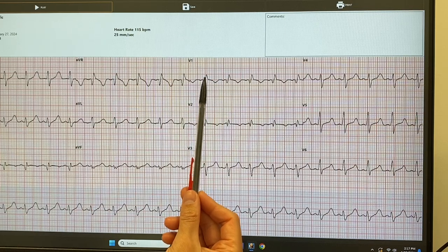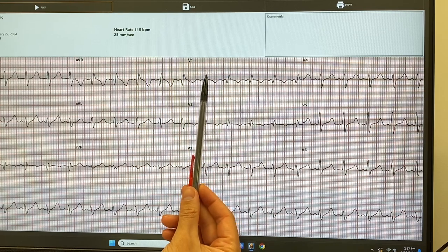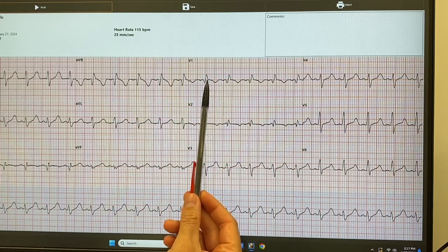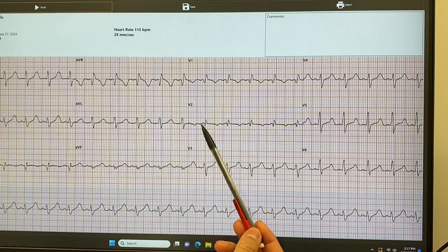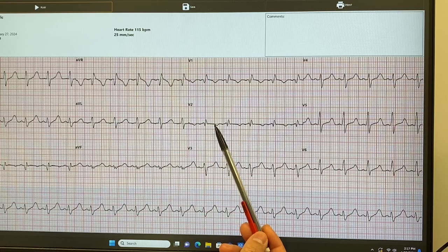So again, look at your P. Three positive waves. I have my P, it's right there. There's my R. Okay, and my T is on an inversion. It seems like they're all inverted. Move on to the next lead. Okay, right here, what do you see there? Inversions as well. Where? My T wave right here.